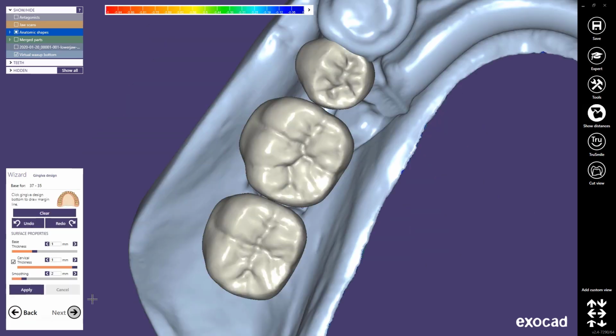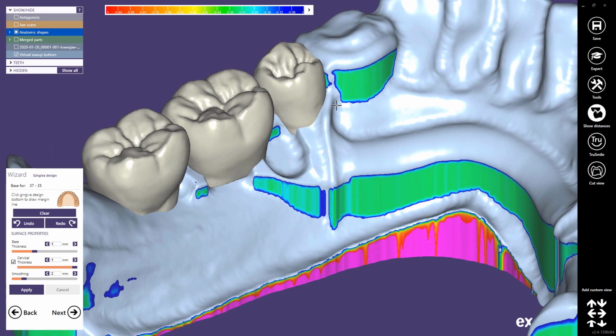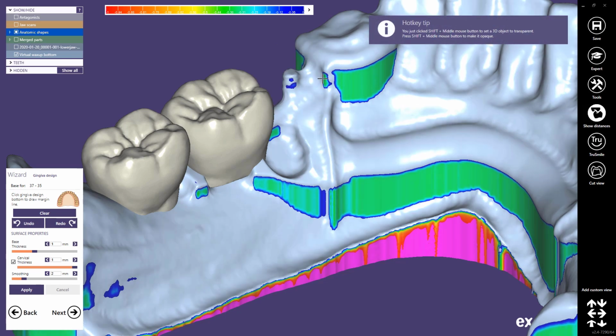In this step, you have to draw the outline of the acrylic parts of your partial framework. You can switch the acrylic dummy teeth to transparent or completely invisible to have an easier line following your finish line when drawing this curve.